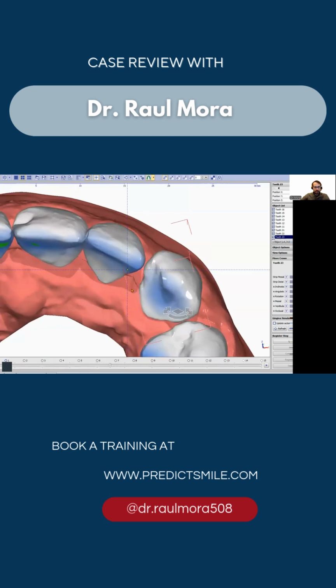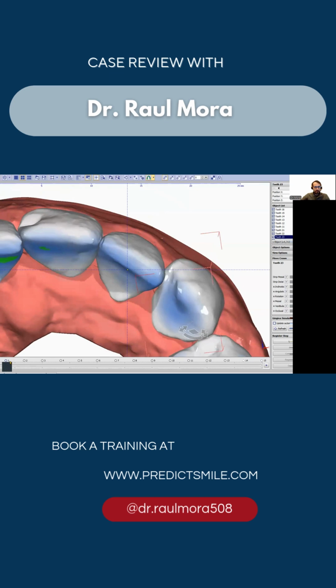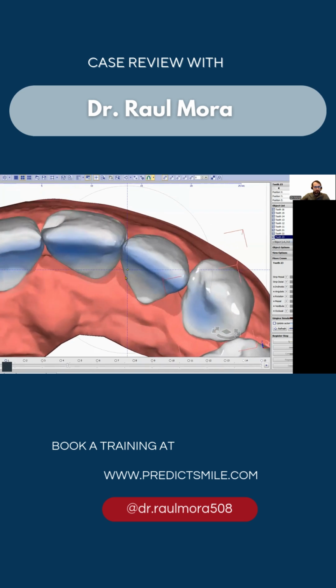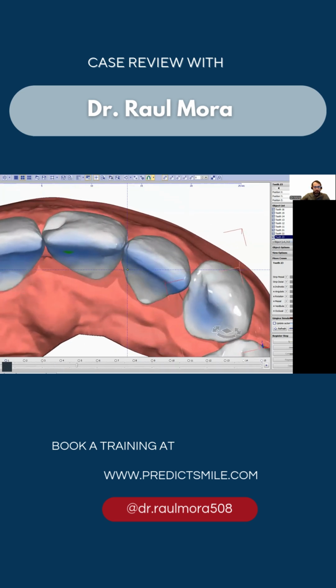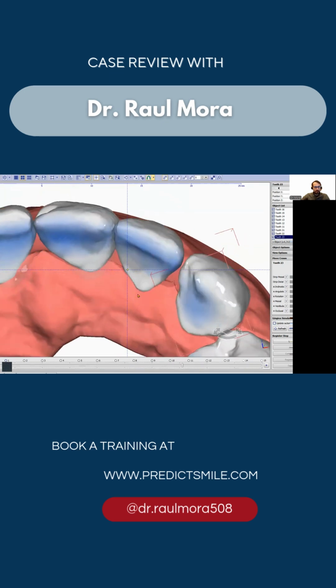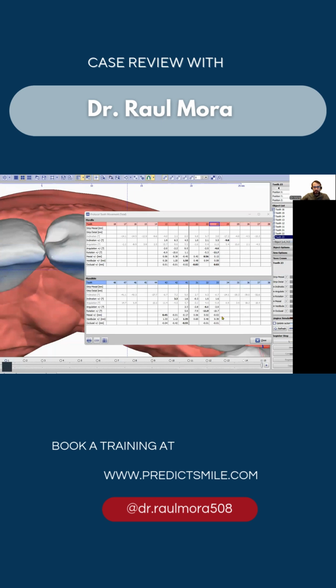So now let's work on this lateral incisor as well. I think the movement needs to be after we start moving the central incisor. So let's move the central incisors first and create some space here. This also helps us to derotate the lateral incisor from the beginning of the movement. Let's check how much movement the lateral incisor has.